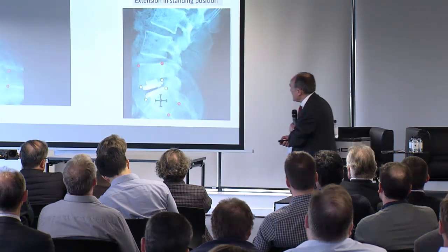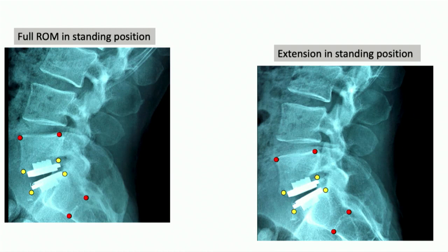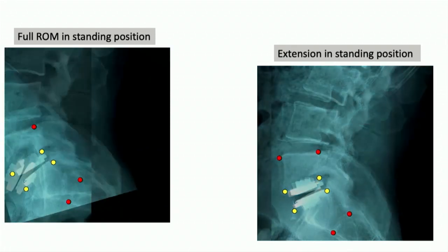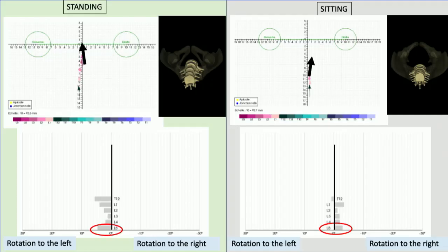So here is the location of the center of rotation. This time there is not really an abnormality. The center of rotation is, we can discuss this of course, but it is below this mechanical prosthesis. And what is strange is this analysis with EOS. You see here the vector of L5 regarding the axis through the two femoral heads. You have this direction standing and this direction sitting.